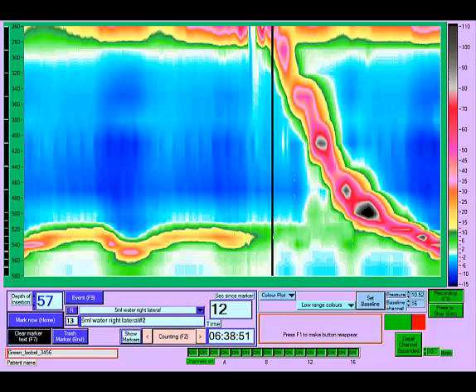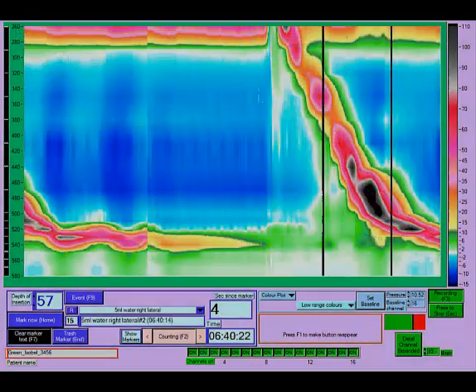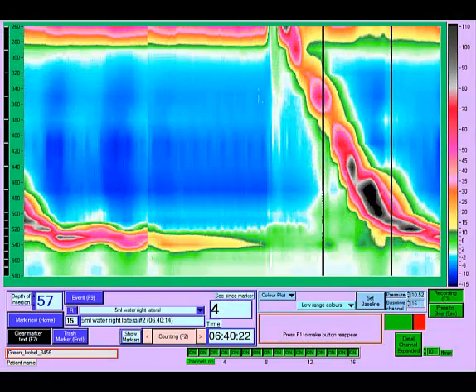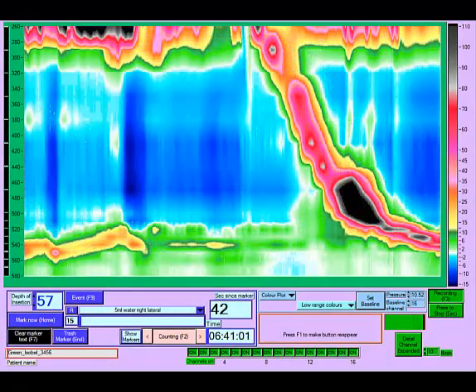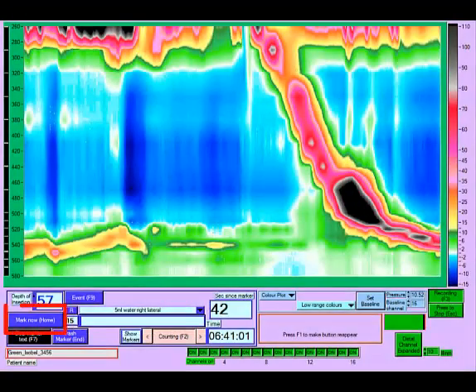If you wish to see the markers that you have already entered, click on Show Markers to display this in the upper left-hand corner. If you enter an incorrect marker, press the Trash Marker button and it will not appear in the analysis. To clear the marker text box, click on Clear Marker Text. You can enter free text into the marker box if required, then press Mark Now to save the marker.